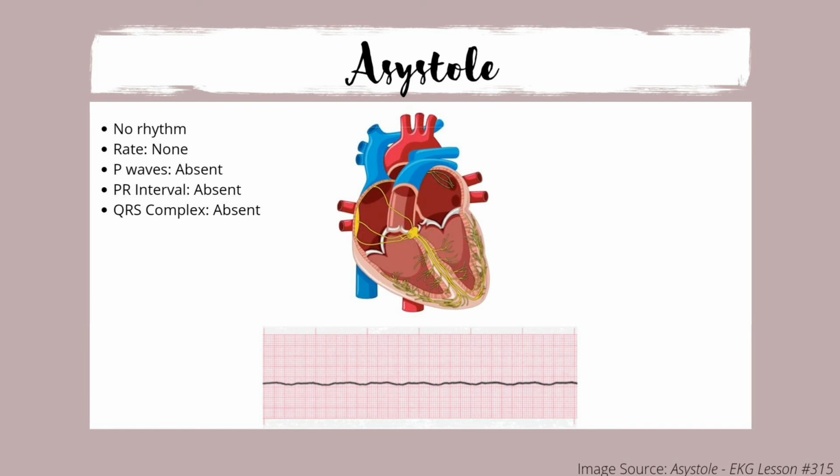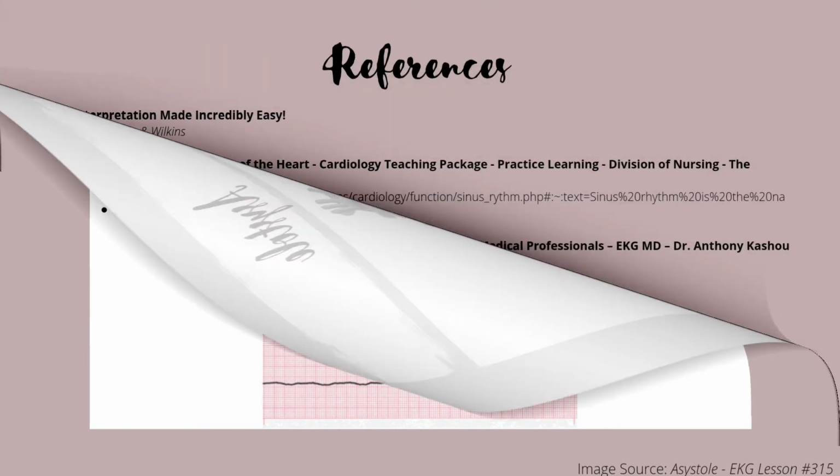Characteristics. No rhythm. Rate, none. P waves, absent. PR interval, absent. QRS complex, absent. It looks like a flatline.